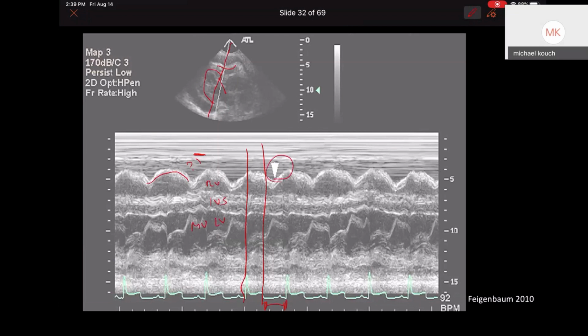Okay. And that's not there in real life. So during our diastolic phase, right, what do we see happening? The RV is collapsed. Right, RV diastolic collapse. Our right ventricular free wall is moving inwards, right? And that's right ventricular diastolic collapse, consistent with tamponade.